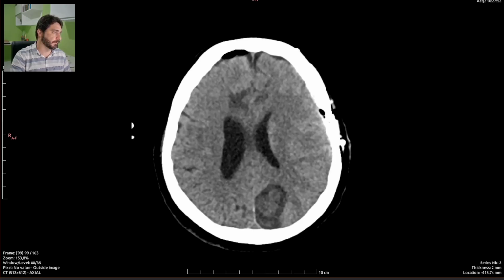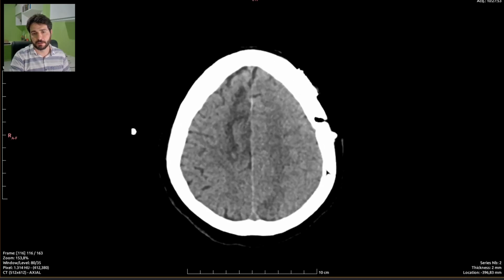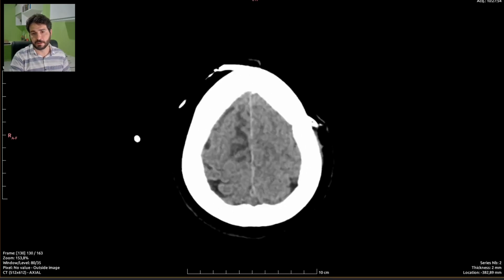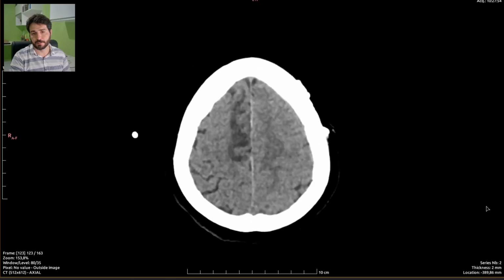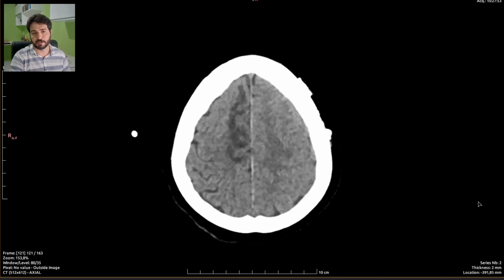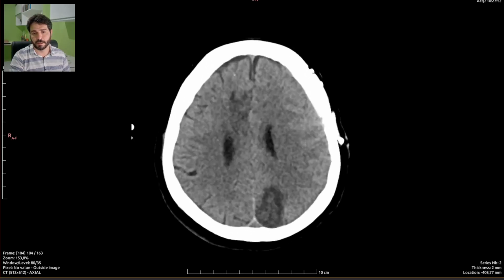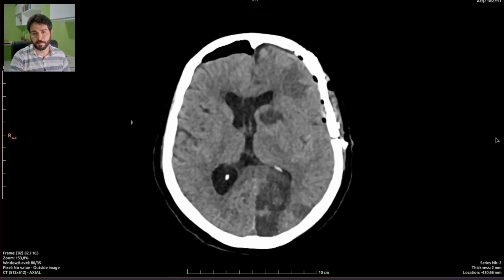and be happy about it. So this is a massive case. There are ischemic changes on the right anterior cerebral artery territory. So this is ischemic arterial change.